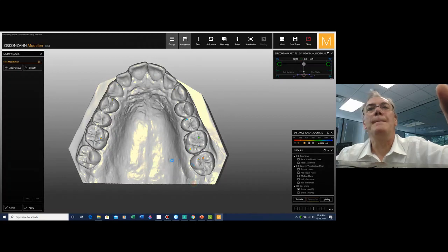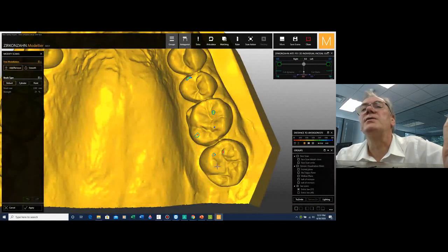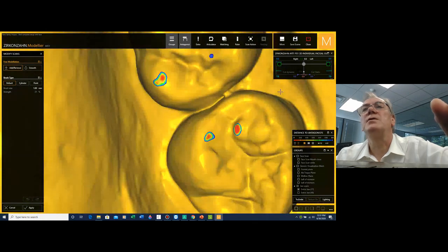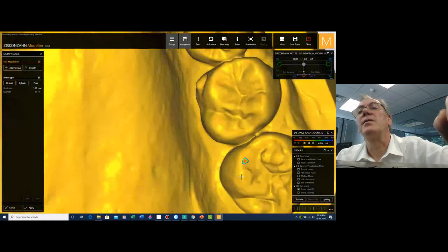So I think it's just really a great way, and I'm enjoying it a lot, being able to perform all the functional analysis on the computer. Therefore, we're going to make our little brush very, very tiny. That's my first contact. It's my stop centric. So I'm leaving it as a stop. We lost the canine, and from here onwards, I am going to start eliminating a little bit of material.